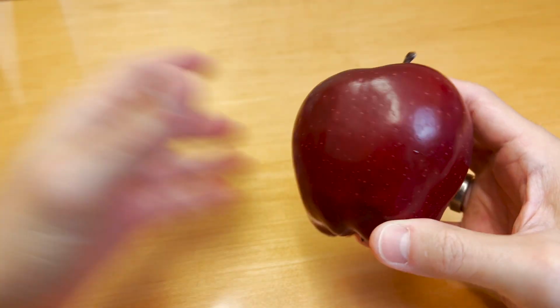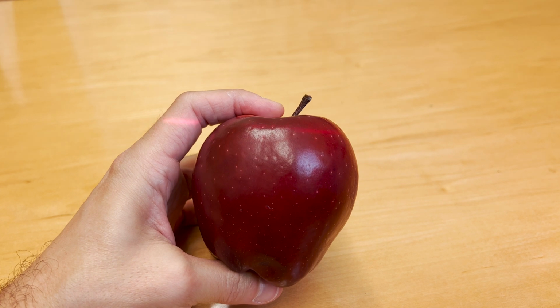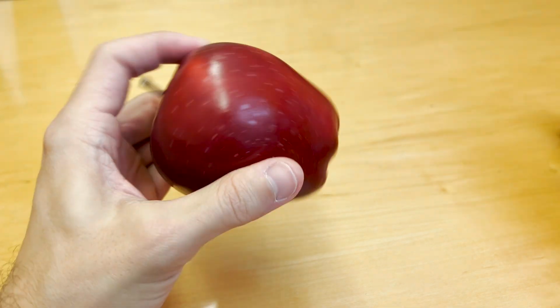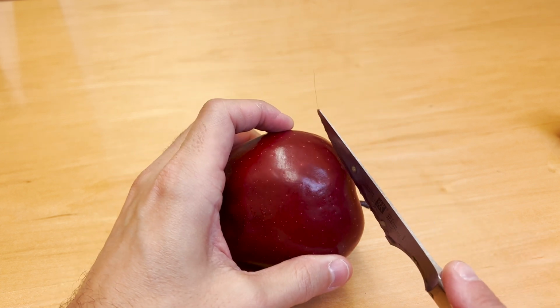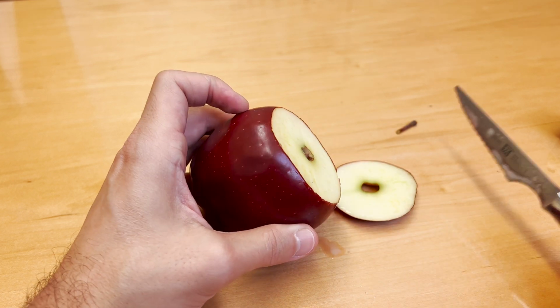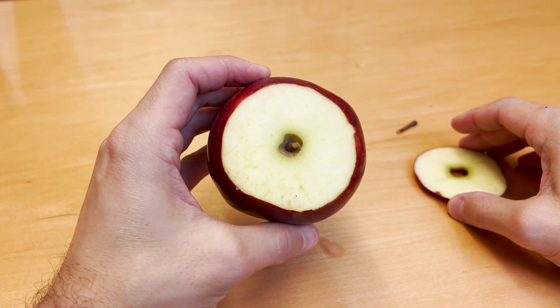All right. So here's our laser device, and we're going to make cuts through the apple just like that. All right. So we'll start down here on the bottom, and actually let's start at the top. So we'll start at the top. So we're going to make a cut right through like the very edge of the top. And then as we've done that, we can see that's the cross section through that top part of the apple.